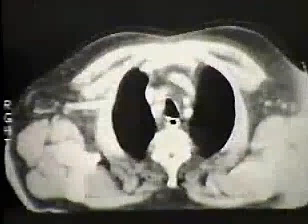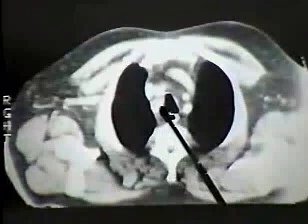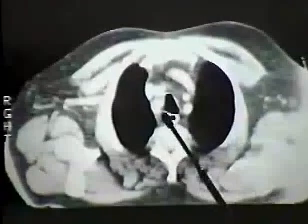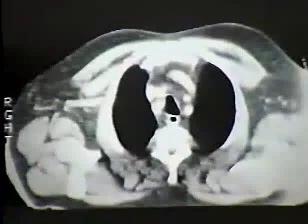If we go to the adjacent cut, we now see the subclavian and carotid arteries here. We're going further up so that the left brachiocephalic vein is heading back toward the left side. And we see 2 shadows here as we transect the brachiocephalic artery twice. Well, I hope that won't be a source of confusion in any future studies. But if you are doing CT scans without contrast material and you're looking for lymph nodes, finding an extra density in the upper mediastinum may be confusing.